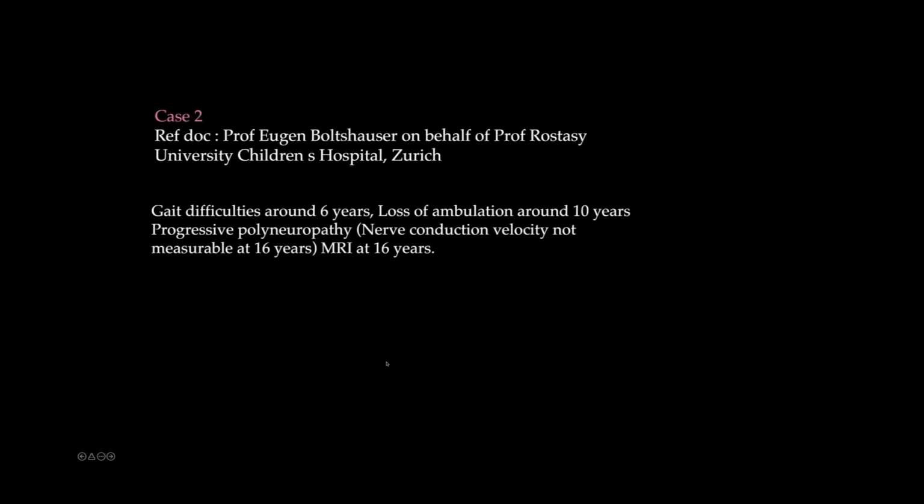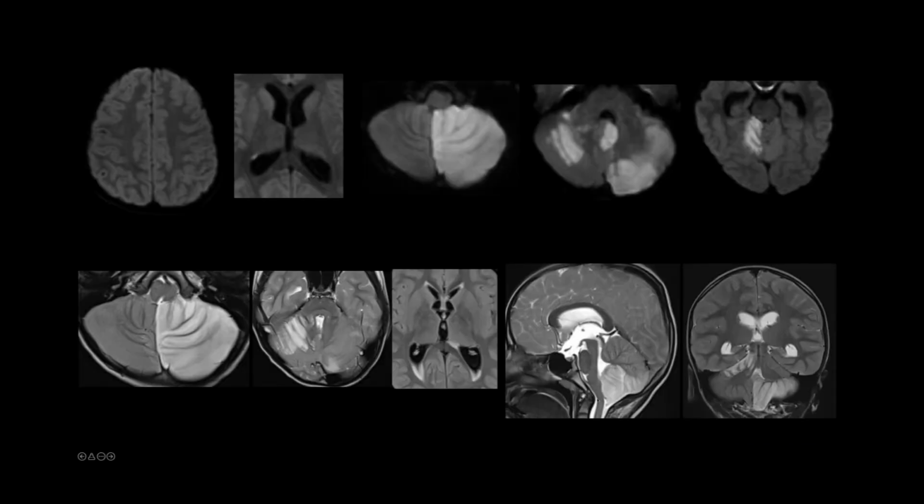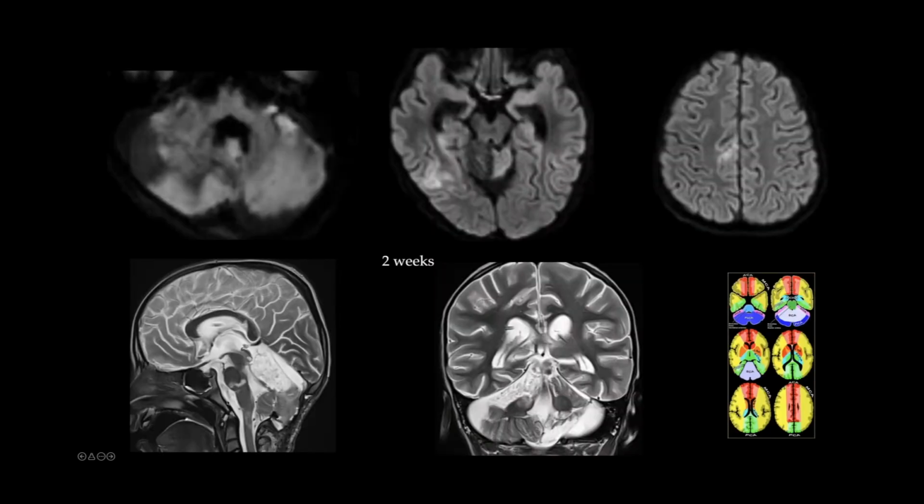And then the clinical question was, Dr. Lokesh, if this is arteriopathy or if this is possibly a moyamoya? Is that the question? Post decompression, are there any abnormalities that we can look at at this point in the acute period? Okay. I think we had a CT done as well for this child initially. Yeah, the CT showed mild basilar impression, I didn't put it up, but that has been relieved or at least improved on the post-operative scan.